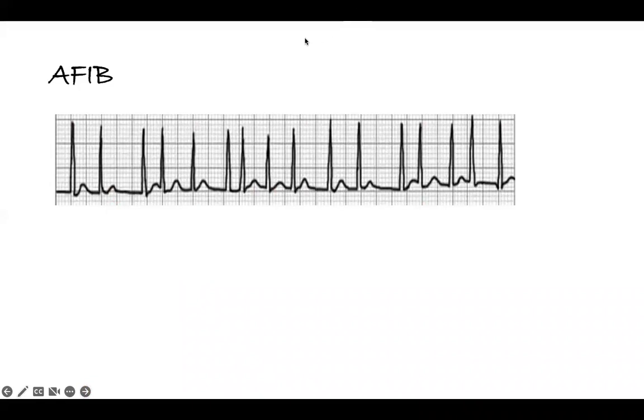Now, AFib, I keep mentioning it because it's common. A bunch of older people have this problem. We go through our process. I need to check my rhythm, whether it's regular. From here to here, I see only 1, 2. From here, I see 1, 2, 3. That's my suspect. Here I just see 1. So just by looking at it, you can see that it's not regular at all. Every time I see an irregular rhythm, I just stop. Looking at the EKG, I know it's AFib. If it's not AFib, it's VFib, but this doesn't look like VFib, so I stop.